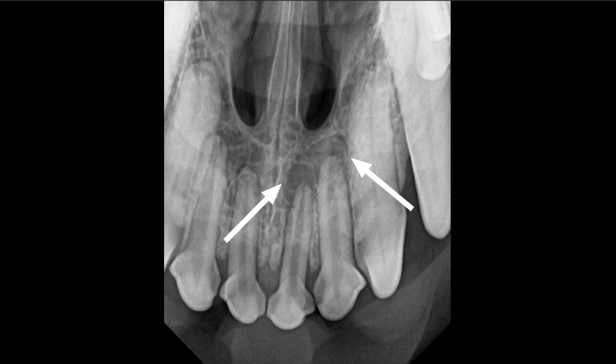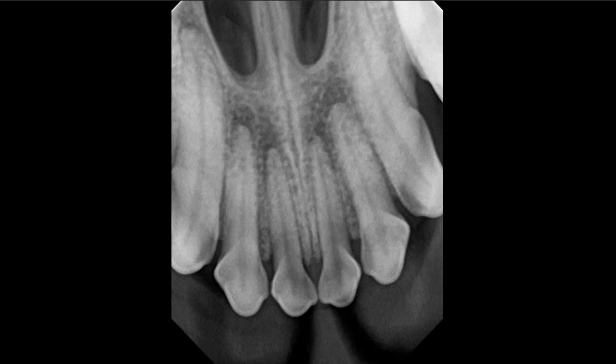The lucency, again, same pathophysiology: tooth dies, necrotic pulp causes inflammation and subsequent bone destruction. So again, those are extractions. They could have root canals done on them. We don't recommend that in general for incisors, but that might be an option. I would never personally recommend root canals on those with that much bone loss. My thought is I want to get that inflammation and bone change gone now, not in a couple weeks when that bone heals. So I'm going to recommend extraction on those every time.